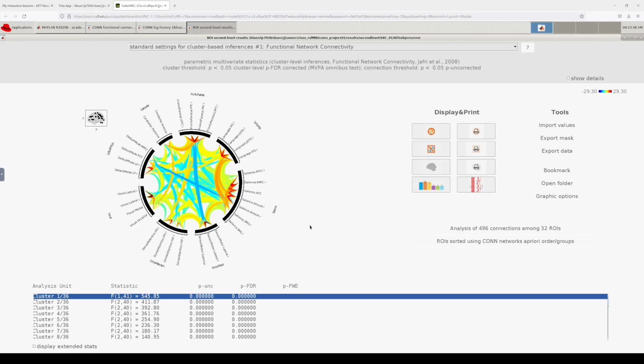This is what we would call the superior temporal gyrus, or this is the posterior cingulate cortex. Just different structures within the brain. And if you know neuroanatomy, then you can know where those are. But it also includes an atlas of functional networks. And so these are based off of either group level resting state networks, what we call intrinsic connections in the brain, or they've also pulled some of this from task-based analyses. And these are averages based off of previous research.